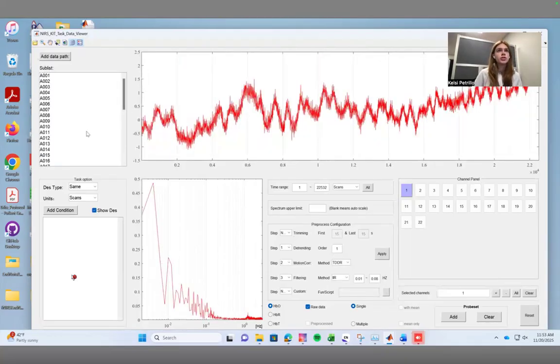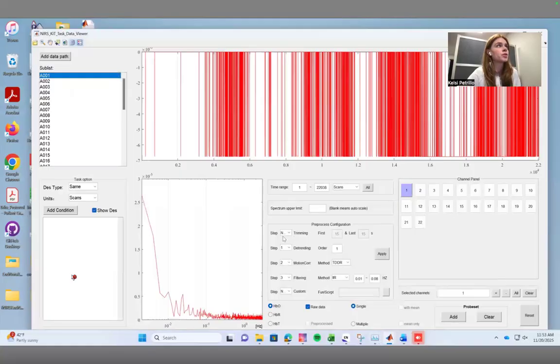So the first thing that you should do, and this part takes some time and also some practice getting comfortable with, but you're going to want to go through person by person and look at their data channel by channel and do a signal quality check. So it seems like this person is going to be a good person to start with because this is not a good fNIRS channel. I can tell that right off the bat just by looking at the way that the data is visualized.